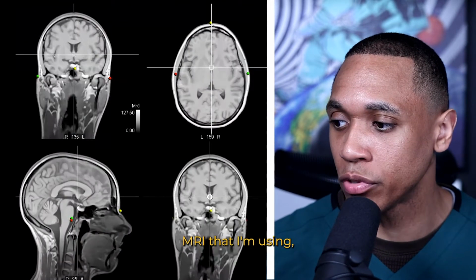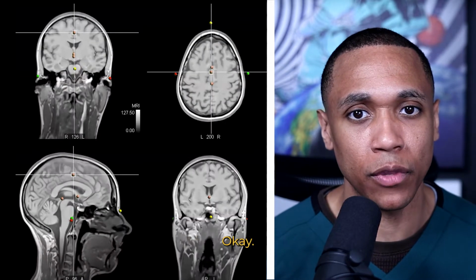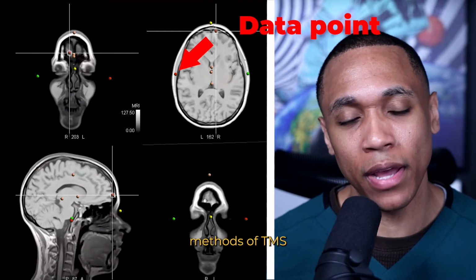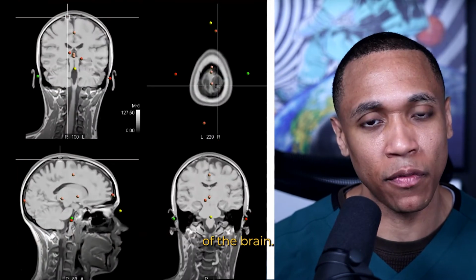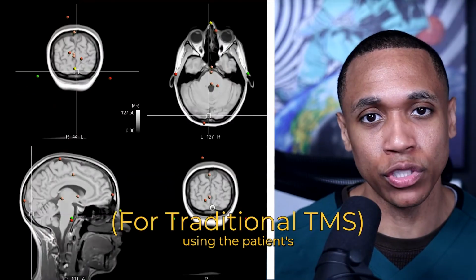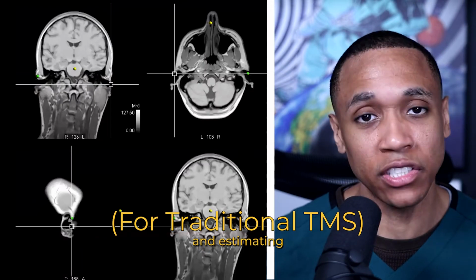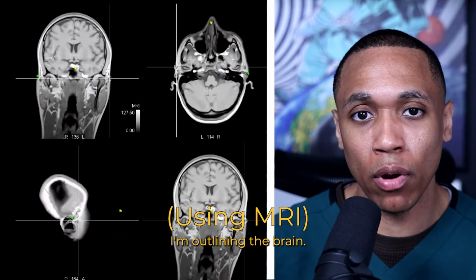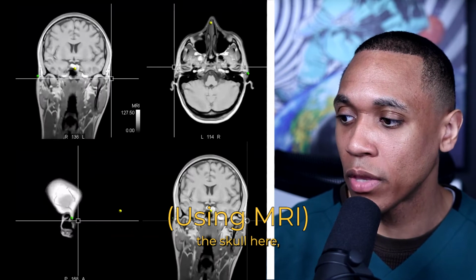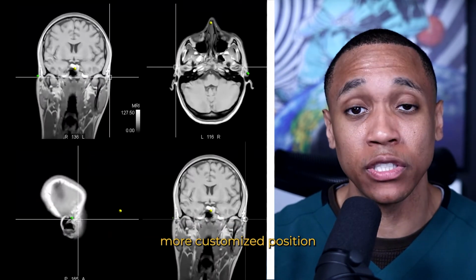Okay, so if we take a look at this MRI here, and this is an actual person's MRI that I'm using, I'm actually going to outline this person's brain. This is different from the other methods of TMS where you don't really take into account the size and the shape of the brain. You're essentially using the patient's scalp or their skull and estimating with an algorithm where the treatment location would be. I'm outlining the brain, I'm outlining the skull here, and that allows me to pick an even more customized position for treatment.